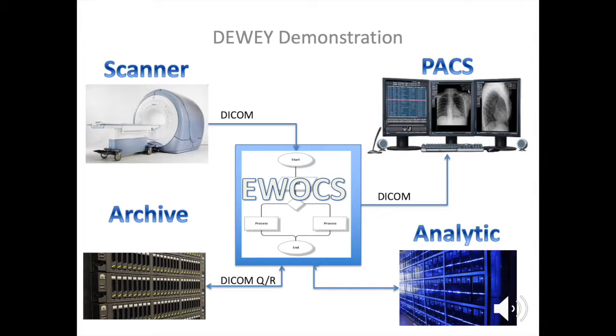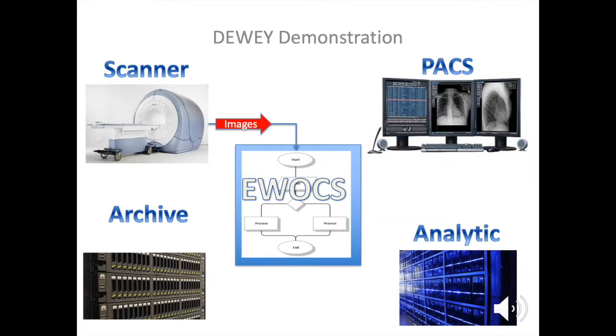First, a quick overview of the components in this demonstration. EWOCS is at the center of the demonstration and will connect all the other elements. We don't have an MRI scanner laying around, so we will instead use the popular program OSIRIX to simulate an MRI scanner. Thank you, OSIRIX.